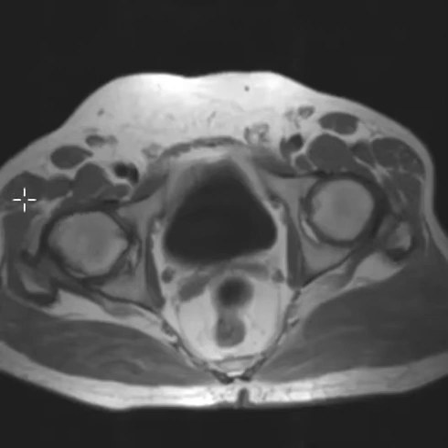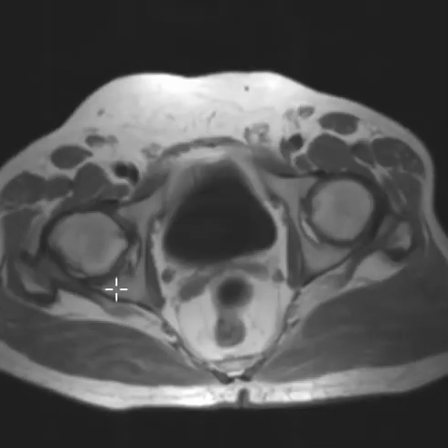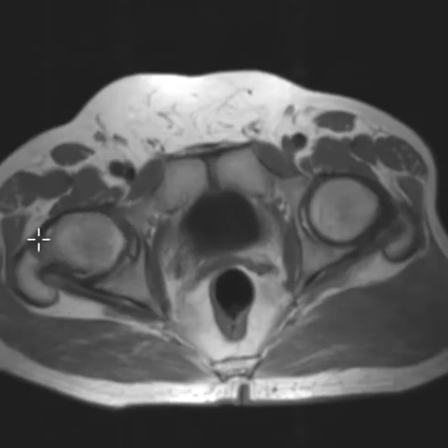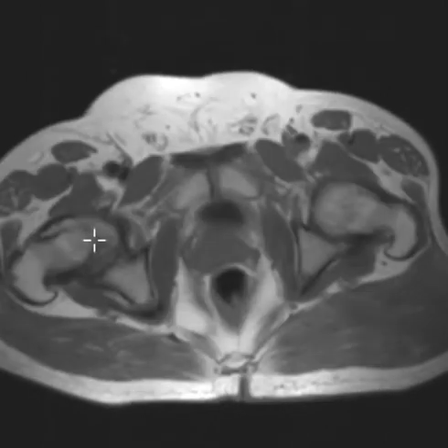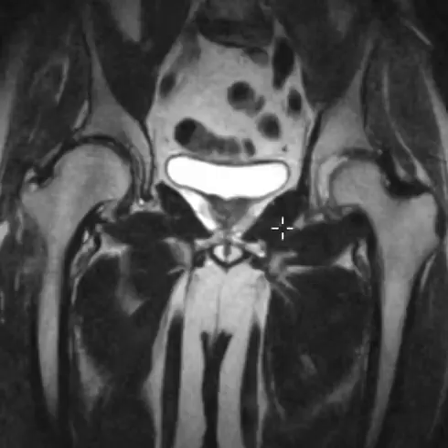This is the lateral front side of the femoral head. Instead of being rounded, it has a broad bony protuberance, like a cam off a camshaft. So we call this a CAM type, C-A-M type, femoroacetabular impingement. This is the femur. The cup is the acetabulum, and so the femur pinches into this. And this is a nice example how prominent that bony protuberance is here along the front, and on the other side how nice and smooth everything is. So an example of CAM type femoroacetabular impingement.